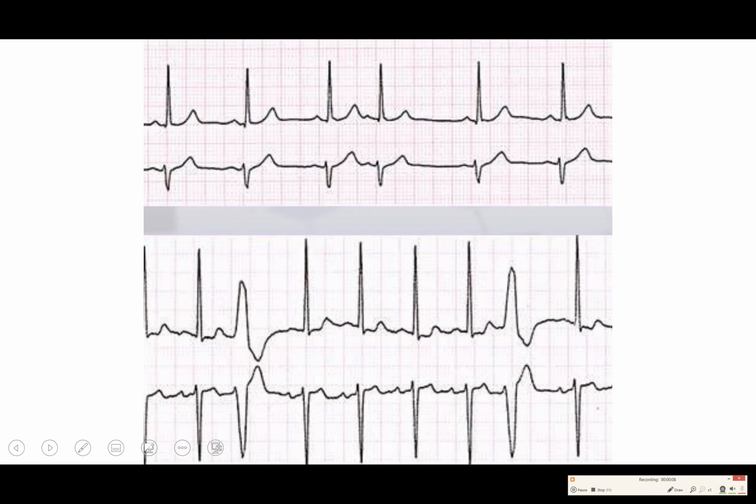Okay, welcome back to ECG Basics. We're doing a rhythm. This is the second of 2 rhythm sessions, just because we had quite a bit of explanation on the first one and just kind of started getting into some explanation and some examples. So if you're joining this video, this is part 2. Make sure you go back and watch ECG Basics Rhythm Part 1. We ended on this slide where we were talking about either sinus arrhythmia, or sinus rhythm that's interrupted with premature complexes.